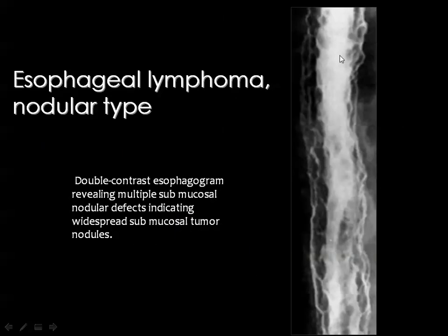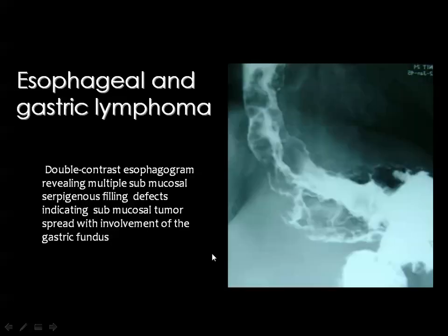This is one of the, let us say, diagnostic forms of submucosal esophageal infiltration, and is not, of course, specific for lymphoma, but if you see a good segment and submucosal infiltration, one may suspect this diagnosis.